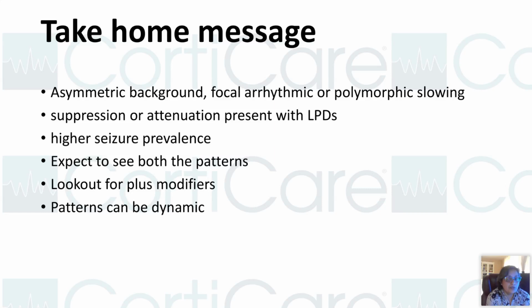With both patterns, there's a high prevalence of seizures. So even if I say it's debatable, both patterns are going to lead to, if they are not attended to properly, if they are not taken care of, the patient is bound to seize. You expect to see both patterns. Sometimes they are interchangeable. Sometimes they are both present.